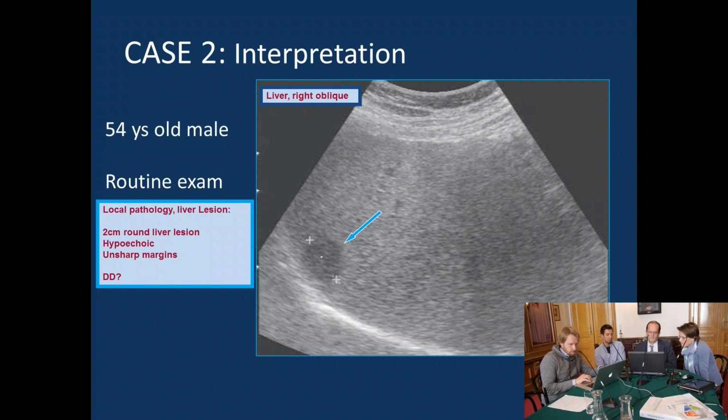Yeah, and if abscesses are that small, they could derive from a bile duct infection, and so there would be more of them, like grapes, because the bile ducts are branching and usually they have more than one abscess. But of course this is a good suggestion, and can be seen sometimes.